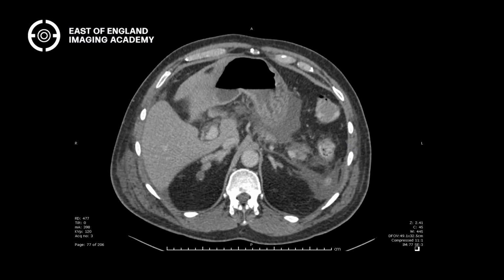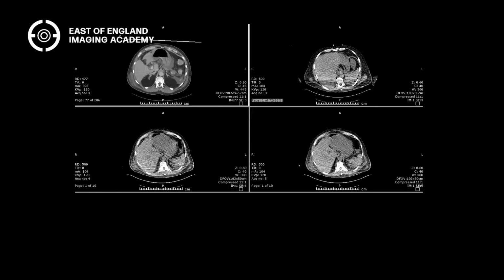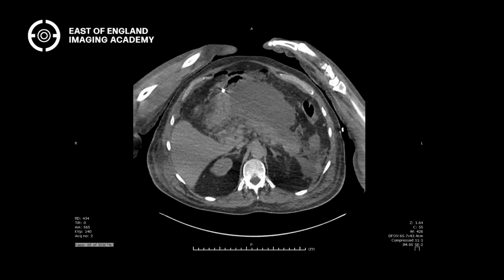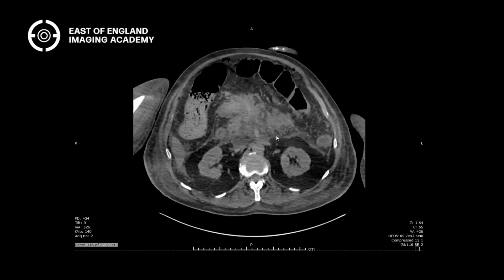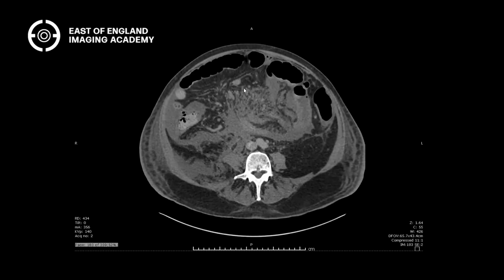So this patient has necrotizing pancreatitis, and why is that bad? Because it's a pretty horrible thing to have. If we have a look, they get really horrible complications. So here, for example, look at what happens. Big collections, yeah, not quite a pseudocyst yet, but it's a big collection. Lots of fluids. This is what third spacing is. You've probably heard of third spacing, never known what it really means.